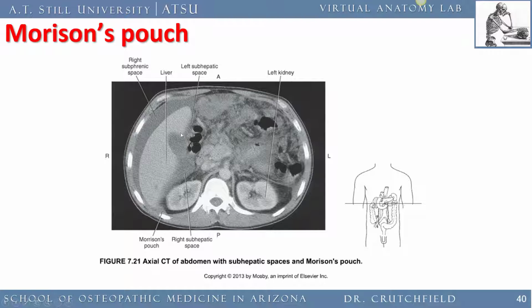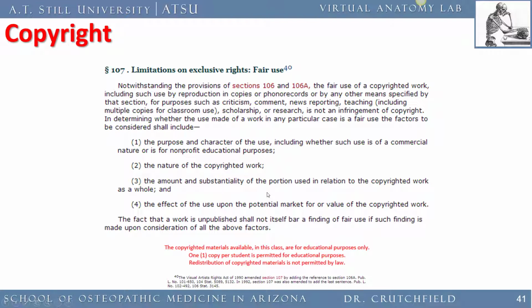So this is liver. Here's gallbladder. This is fluid. All of this right here, this should not be there. Okay. And that little bit of fluid in Morison's pouch should not be there either. Of course, this is the fascia of the retroperitoneum. I guess you could call that Gerota's fascia. Not really sure there. Anyways, so we've covered the retroperitoneum, the kidney, the adrenal gland, the spaces, and we'll go on and look at more structures of the abdomen itself when we move to the GI system. Thanks for listening.